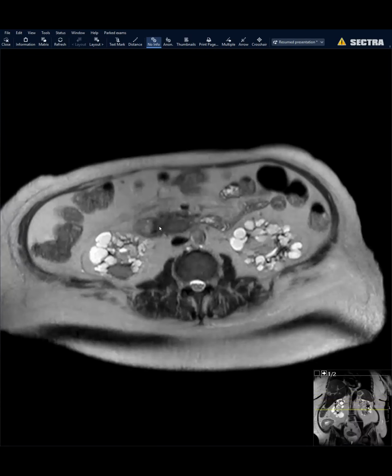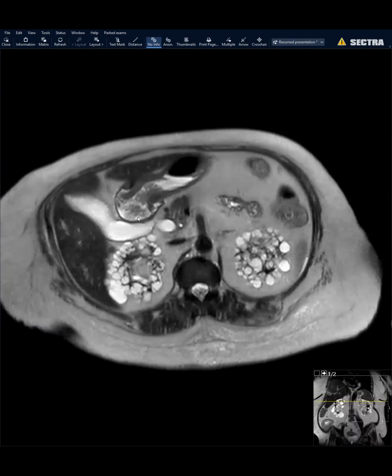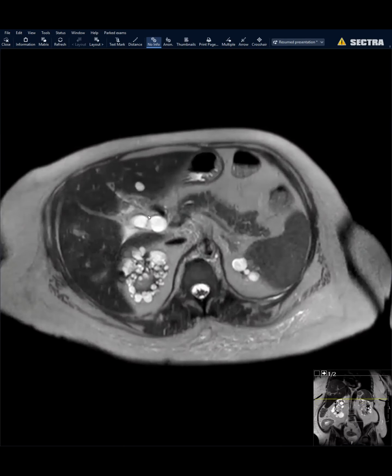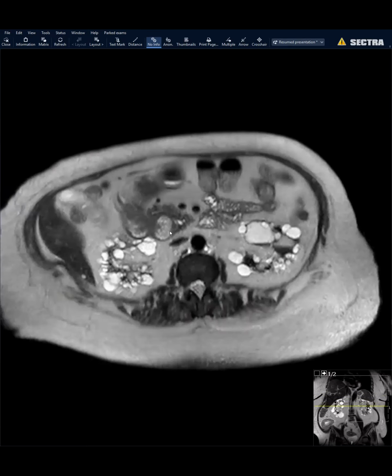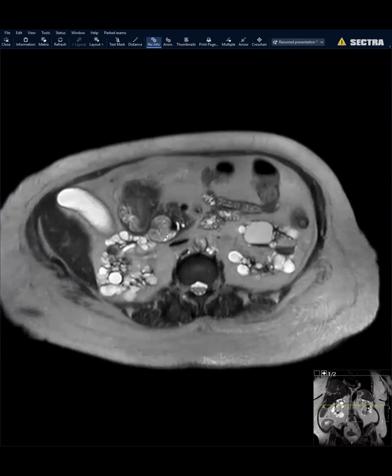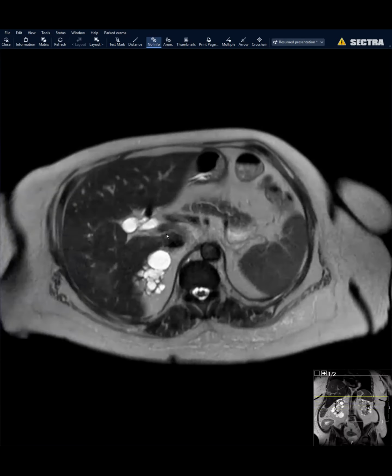On the MR, I think it's sometimes easy to not see intraluminal masses, but when you see it in the stomach, very nice frond-like morphology is appreciated when there's a little fluid in the stomach. But smaller polypoid masses, I think, are easy to miss on MR if we're not specifically looking for it.